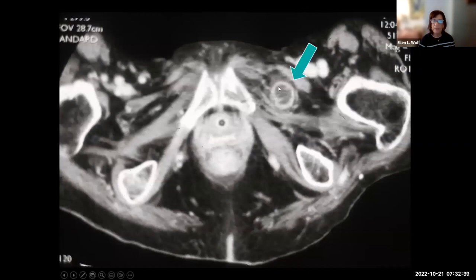So this is an obturator hernia. We can see here that there's bowel, which doesn't belong between these two muscles. This was obviously on the left side. This is supposed to be more common on the right side. But remember, we have to look at all the corners of all the films, and this was on the lowest scan, lowest image, obturator hernia.